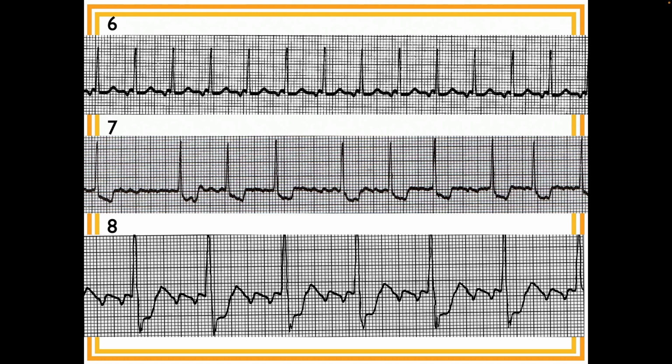I think I've already said this, but I'm gonna say it again. I'll say it again at some point. The only way to learn atrial flutter is to recognize flutter waves. There's no other way to do it.